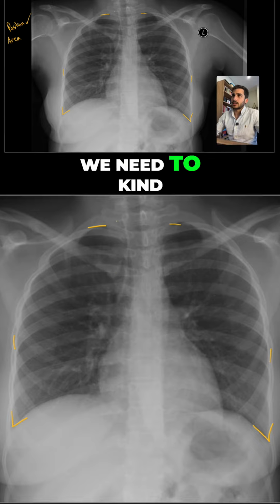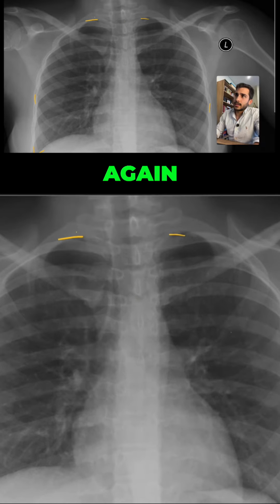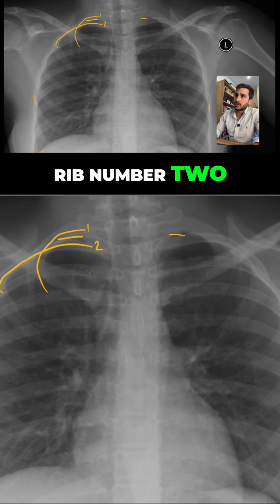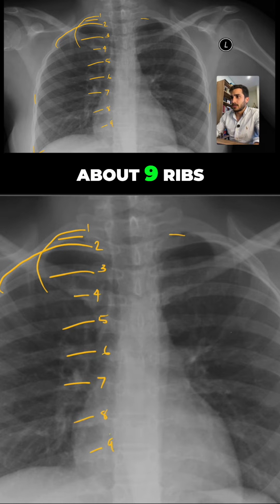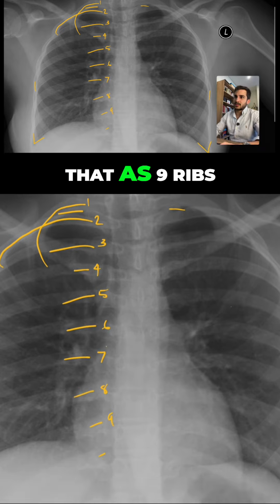Well, for that, we need to kind of count the ribs. So if I just zoom in a little bit here, again, that first rib is always that sort of C-looking shape. So that's rib 1. This is rib number 2. Okay, this is rib 3, 4, 5, 6, 7, 8, and a little bit of 9. So we see about 9 ribs, and basically not really 10. So I would just count that as 9 ribs.